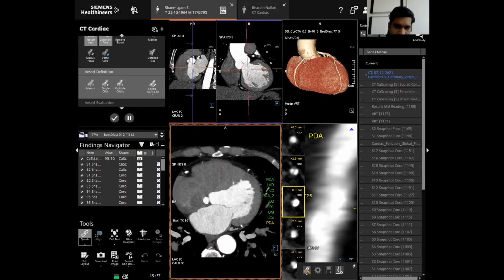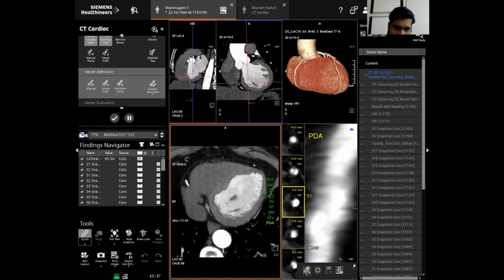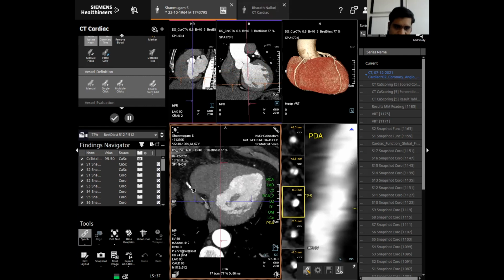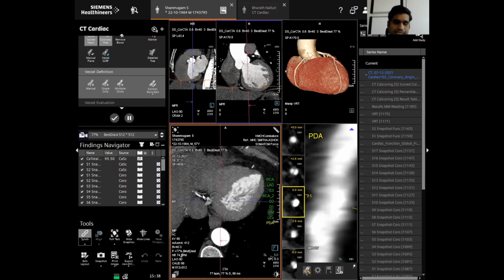As I go to the inferior aspect, this right atrioventricular groove continues, and this region is inferior aspect of right atrioventricular groove, and it reaches to a point. This is crux. So crux is nothing but the point where inferior aspect of the right atrioventricular groove meets posterior interventricular groove. So this point is called crux. The importance of the crux I will explain later. The exact opposite point or exact diagonal point of crux is apex. So this is apex, which is directed towards left side.